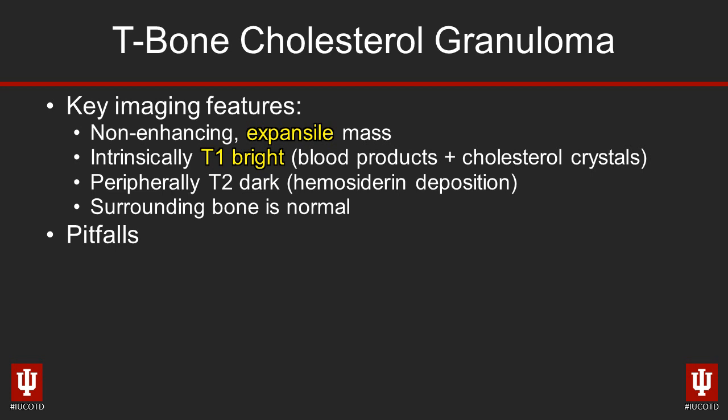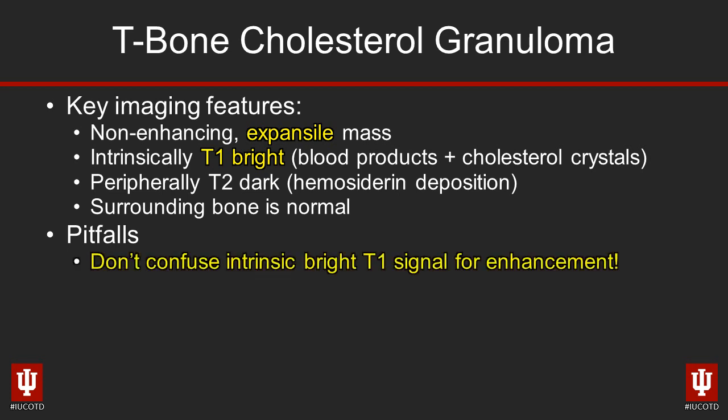Important to keep in mind, the surrounding bone is normal. There's no edema in the adjacent bone. This is a benign actor, and you need to recognize it as such.